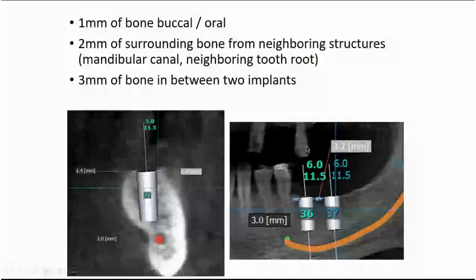in this picture, in the right part of the right image, I placed the implant about 6 millimeters in width. And it is an old picture, and today I prefer to go with as little titanium as I can, and to leave as much bone as I can in specific situations. When we are talking about the second rule, it is 2 millimeters from surrounding bone structures.